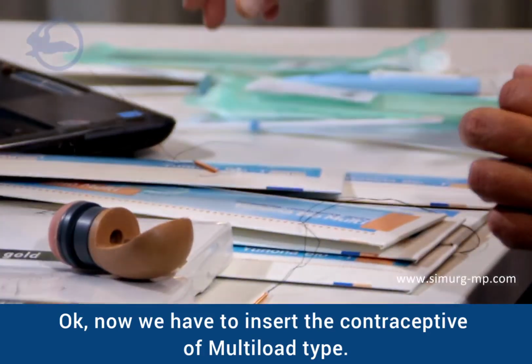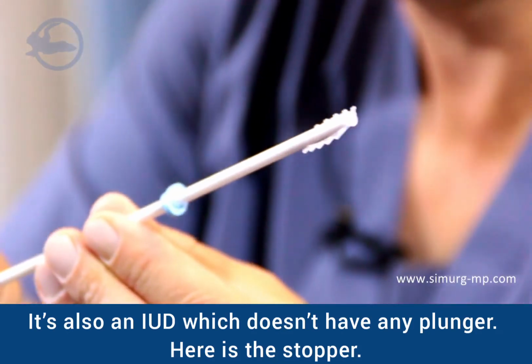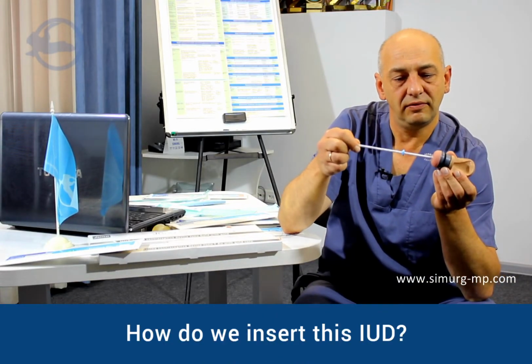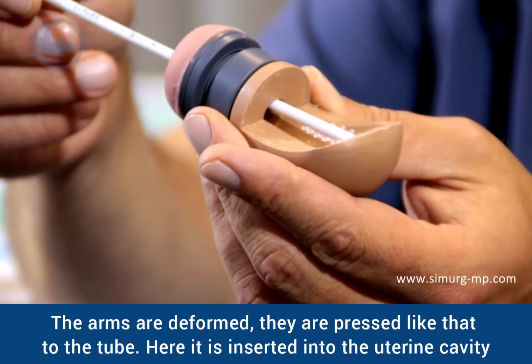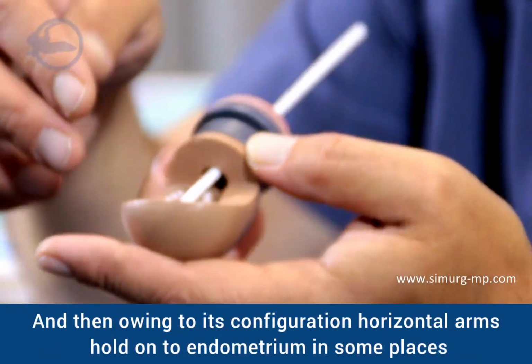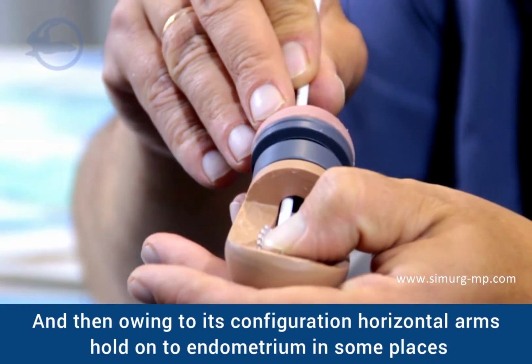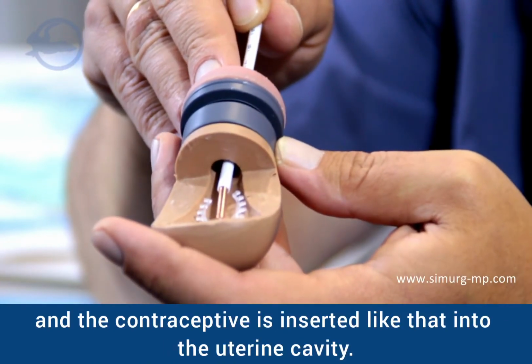Okay, now we have to insert the contraceptive of multi-load type. It's also an IUD, which doesn't have any plunger. Here is the stopper. How do we insert this IUD? The arms are deformed, they are pressed like that to the tube. Here it is inserted into the uterine cavity. And then, owing to its configuration, the horizontal arms hold on to the endometrium in some places. And the contraceptive is inserted like that into the uterine cavity.